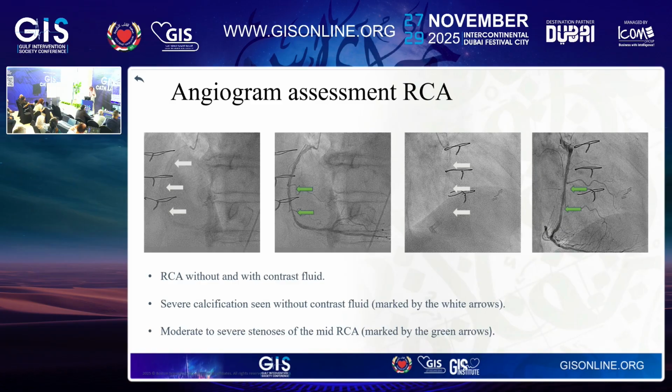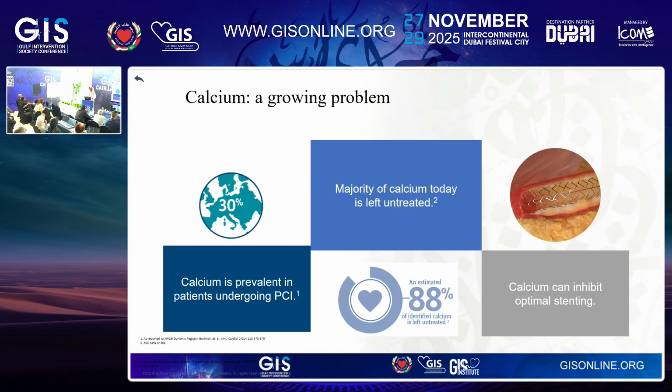So the extra information that you look for is, where is my landing zone? This is so diffuse. I'm seeing calcification, or there is something more than calcification, as we're going to discuss. And if there is calcification, what am I going to do about it? I'm just going to take a stent and inflate it. So this is where imaging added more information to us.